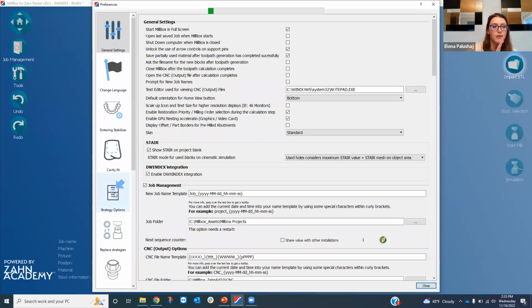So, strategy options. There's a lot of options.